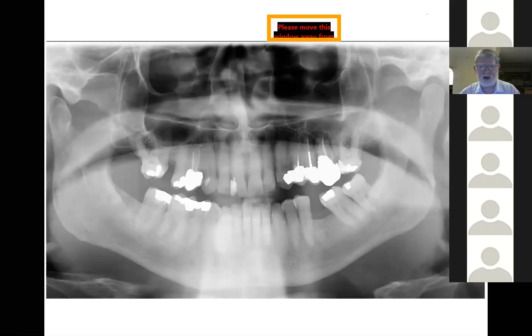Moving on here. Something very, very unusual in the upper arch, which would be a dentist or an oral surgeon's nightmare. Okay, is that divergent roots of the 1-7? Yeah, and ankylosis, possibly. Very good.